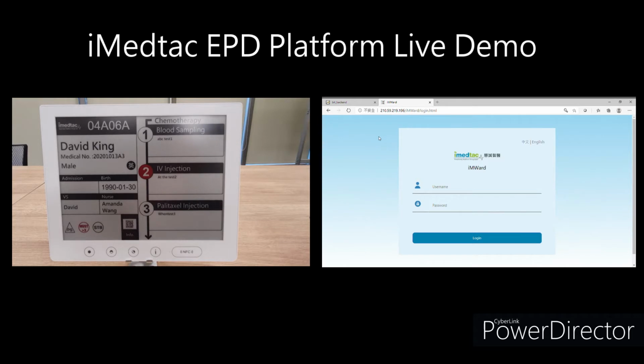Hi everyone, in this video we're going to introduce how to use the management platform to create a new patient, and also update the patient information, caregiver information, daily care information, and manage your EPD devices.